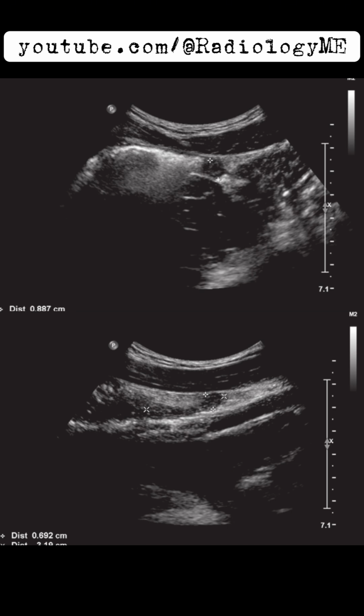Now, thinking about what the examiners may ask during the viva, they might want to know about the typical ultrasound criteria for diagnosing appendicitis, namely an appendix greater than 6 millimeters in diameter, non-compressibility, and hypervascularity on Doppler imaging. They might also probe about the imaging modality preferences for different patient demographics, for example, preferring ultrasound over CT for children and pregnant women to avoid radiation exposure.